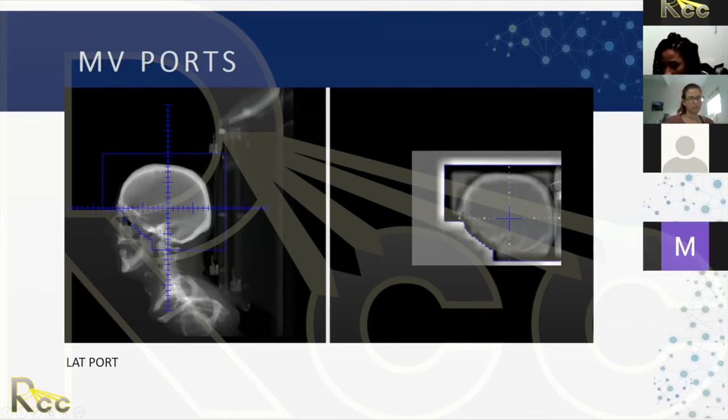You can see that here's the orbital bone right there. You can see that that block is right along the orbital bone there. Once you come down in this area, you can see I'm tracking really well in the same area. And then similarly, if you use the graticule to count, either from left to right or up to down, you would get the same numbers. And so this makes you feel confident about treating this particular patient.